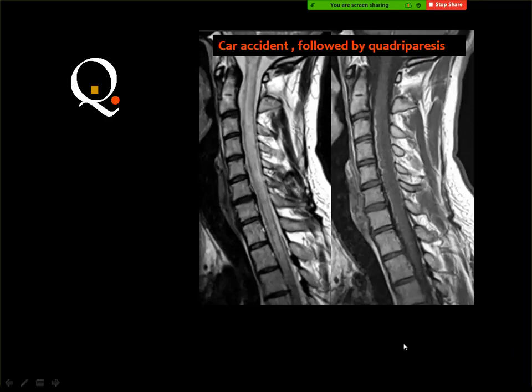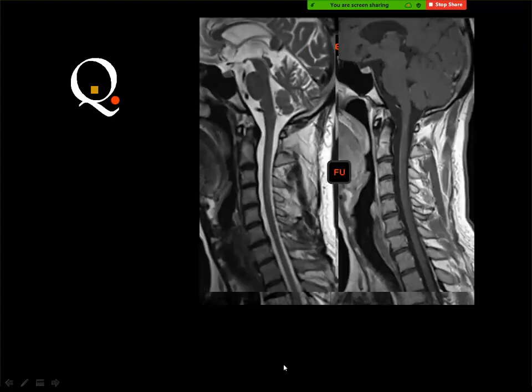And this dural arteriovenous fistula is suspected by these dilated vascular channels along the margins of the cord, and this fistula has resulted in a diffuse parenchymal abnormality of the substance of the cord, which may be attributed to edema or ischemia.